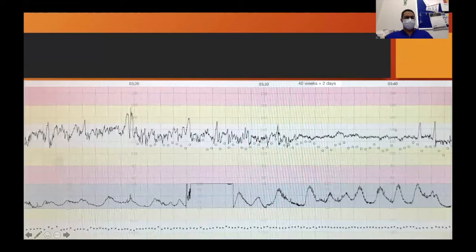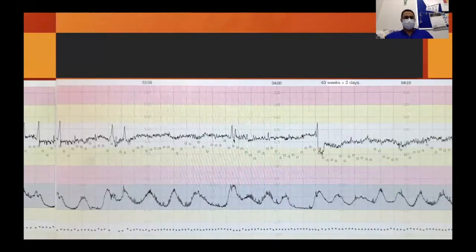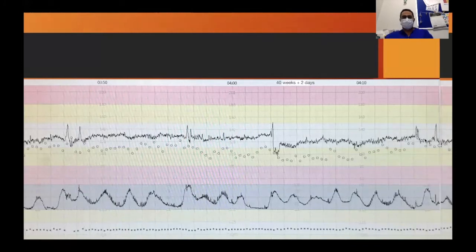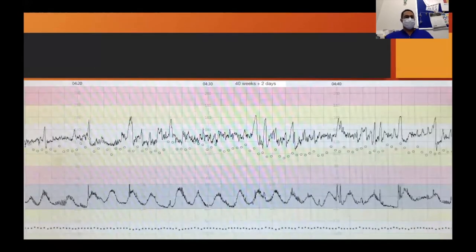Okay, so lots of activity. And then the baseline settles to about 120, maybe a bit of waking up. Okay, but it's pretty much been the same. And baby's awake again. So happy baby? We're happy to carry on.